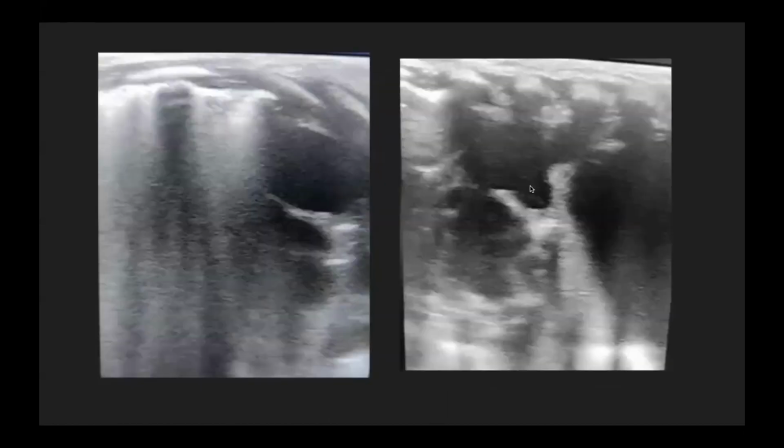Here in this sagittal image, we could see that a part of the lung is showing confluent B lines, and just after that, this mass starts. So the mass is probably lying at the caudal end or the lower lobe of the lungs, and the upper part of the lung is also showing fluid, increased fluid within the alveolus. But since it was a newborn, sometimes delayed clearance of lung fluid can give this kind of appearance.